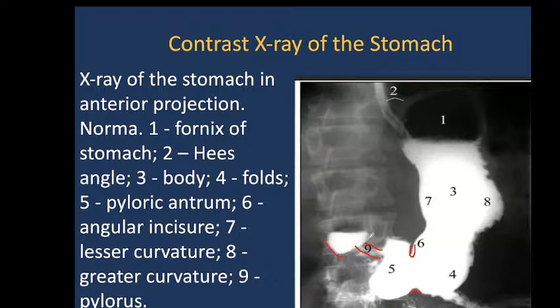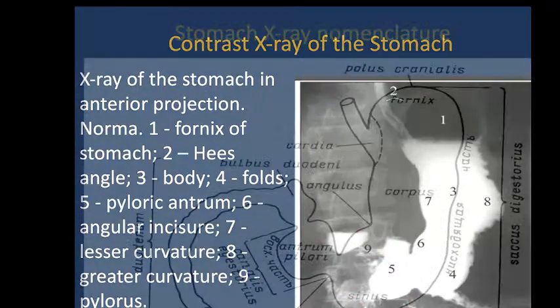This is the initial, the first part of the small intestine, duodenum. And we see also the contrasting fluid inside of the duodenum and even in the jejunum.